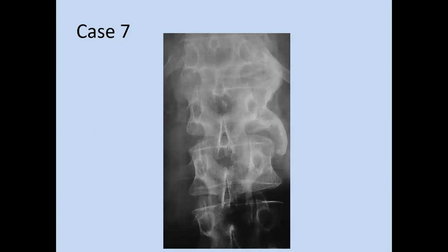X-ray of the lumbar spine, showing an area of ossification on the left side of the vertebra. It mostly goes with parasyndesmophyte, and it's mostly a case of psoriatic arthritis. Yes, very good.